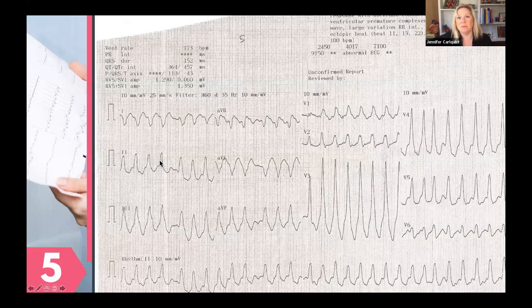And so if we missed this and gave this patient adenosine, because some people have said, I just like to slow things down to see what it is, right? That's not the right answer here, because if you give this patient adenosine, you could do basically what's called a clean kill. If you kill the AV node, the impulse has no other way to go but down from the SA node down to the ventricle.